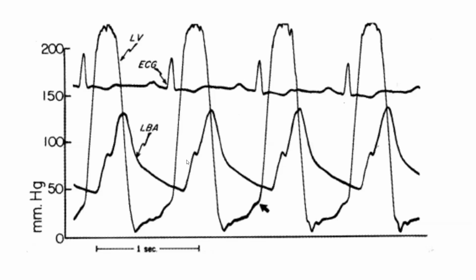The morphology is suggestive of aortic stenosis, not LVOT obstruction, simply because you have a nice anacrotic notch. That's one. You have a rounded LV morphology. You don't have that late peaking dagger shape, and you don't have a spike and dome. So this is aortic stenosis with anacrotic notch.